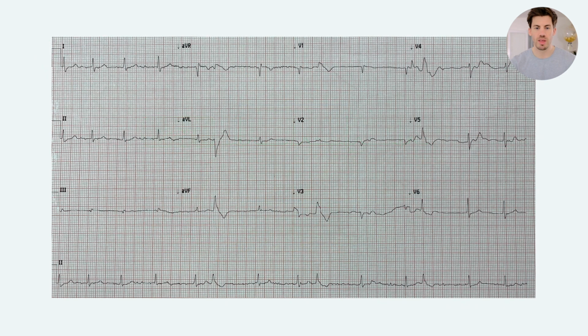So let's have a look at this ECG. Again, standard 12-lead ECG. On the left, we have our 6 limb leads, 1, 2, 3, AVR, AVL, AVF. On the right, we have our 6 chest leads, V1 going through to V6. And then we have a ribbon strip along the bottom, allowing us to look at the rhythm of the heart over a prolonged period of time. It usually chooses lead 2 or V1. So in this ECG, is the rhythm regular or irregular?